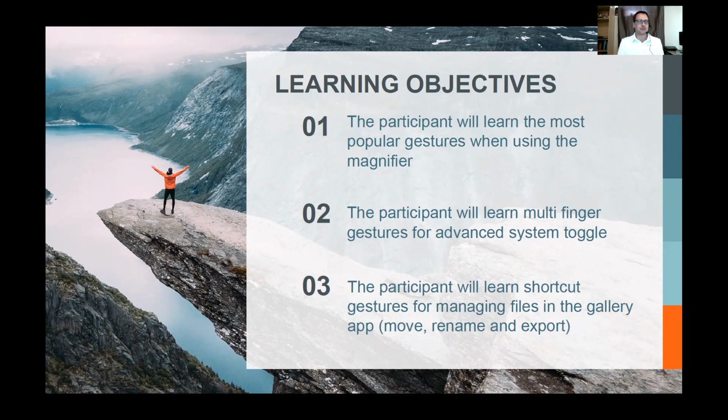This webinar was an idea from Herrick. Herrick, if you don't know, is new to the company, and he was learning all about the Prodigi software, the Prodigi Connect 12, and the Prodigi on the Reveal 16i. He said it would be great to have a webinar just talking about gestures we can use to be faster in our decisions when using the Connect 12 or the Reveal 16i. So I'll be showing that today.